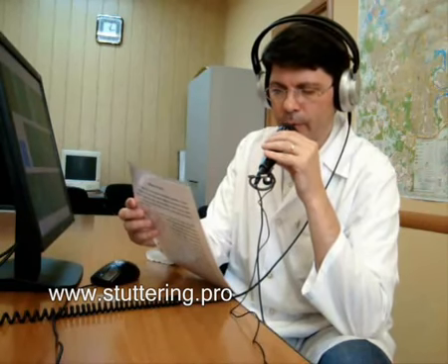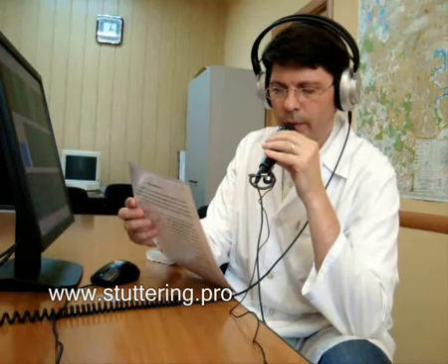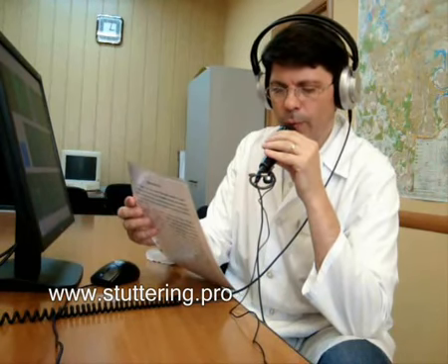Second, it lowers the pitch of the voice. What in its turn relaxes our vocal cords. It's called frequency shift auditory feedback.